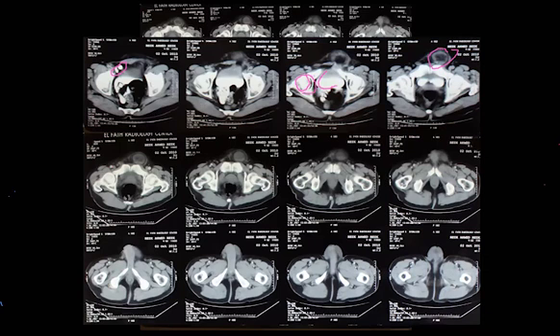And what is the area that is empty, just medial to the vein? الاريا اللي لونها اسود دي شويه hypodense. What is this area? الفيمورال canal. The femoral canal, absolutely. It may be. نرجع بقى نقول what are the structures that you have seen, the two hyperdense structures that you have seen in this upper part, in this upper image.